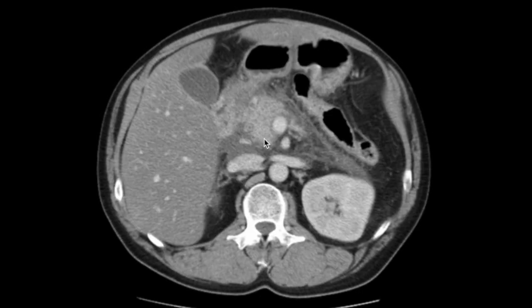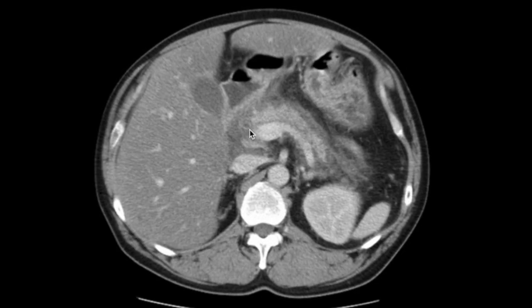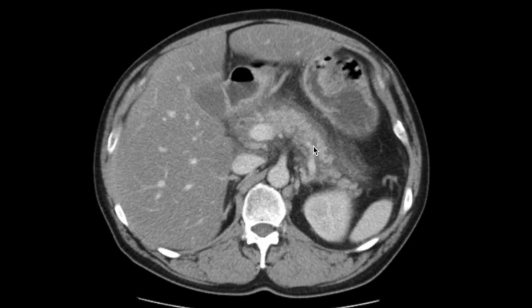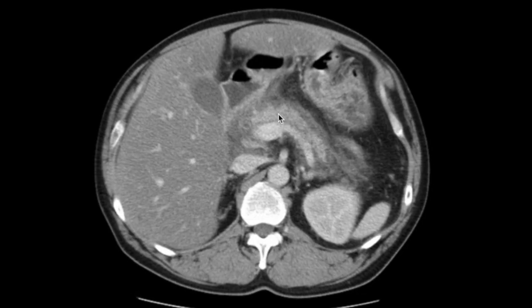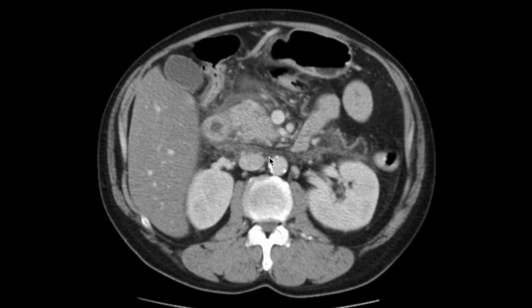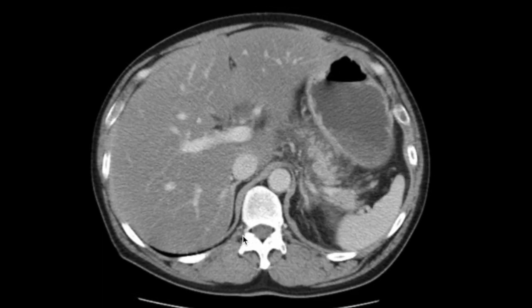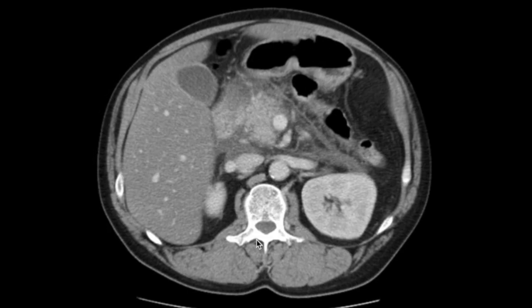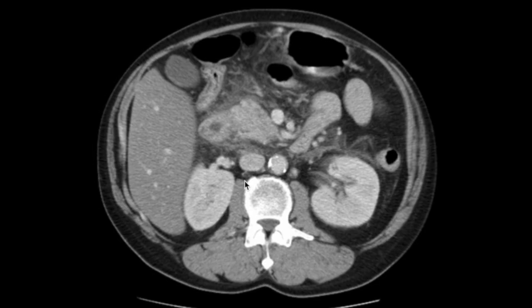Similarly, if pancreatic cancer were obstructing the duct, you'd expect to see a large tumor and dilatation of the pancreatic duct. These findings are absent, so pancreatic cancer is also unlikely. In fact, this patient has a history of alcohol dependence. Since imaging rules out common bile duct stones and pancreatic cancer, and there is a history of heavy drinking, an alcohol-induced pancreatitis is the most reasonable conclusion.